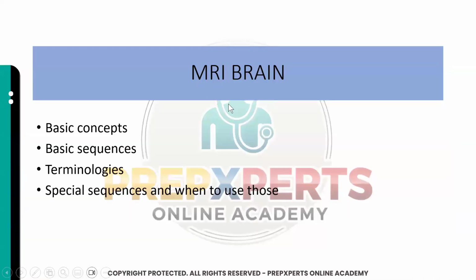So in MRI brain, I will be going through the basic concepts, basic sequences, some important terminologies and special sequences and when to use those. This is very important. In each and every FRCR 2A exam, there are always 1 to 2 questions about sequences, and most of those sequences are new. Especially for those who are not actively reporting MRIs, these might be confusing.